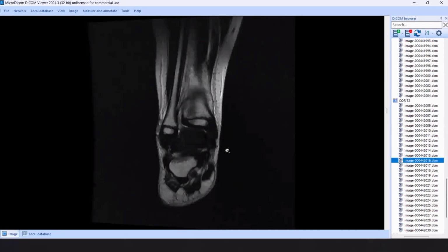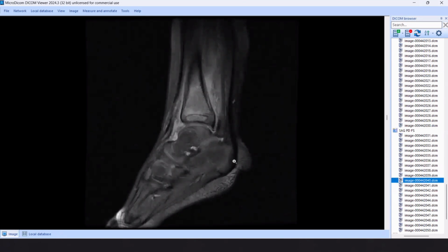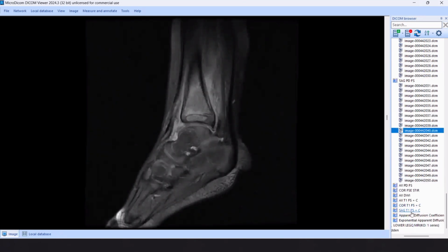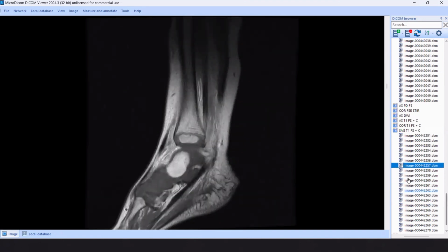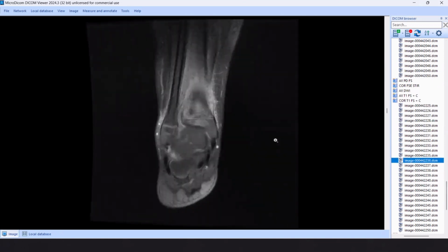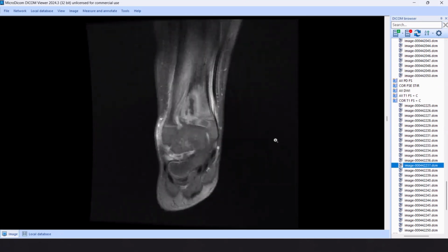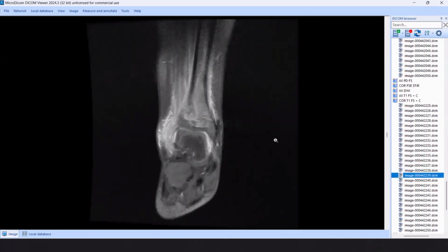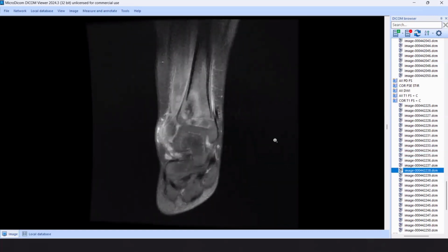Okay. Really, when I saw this case, I suggested Brodie's abscess at this area. And I think we did sagittal T1 with contrast. I think coronal will be much better for you. It's briskly enhancing, and even the soft tissues are also enhancing. We have also reactive changes, significant edema changes, periarticular and periosseous. And this one is helpful to determine that we are dealing with an osteomyelitis or infection.